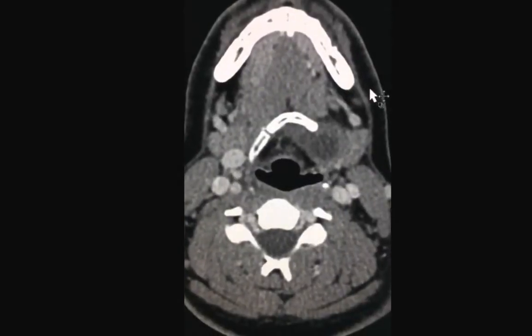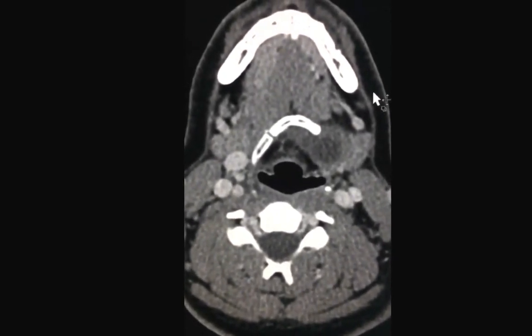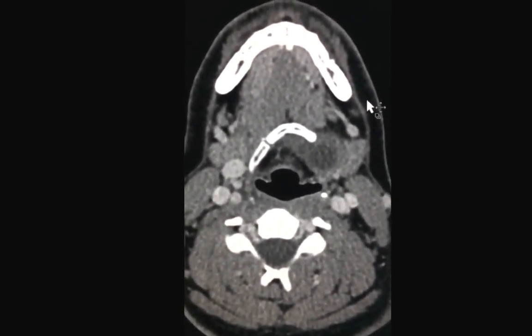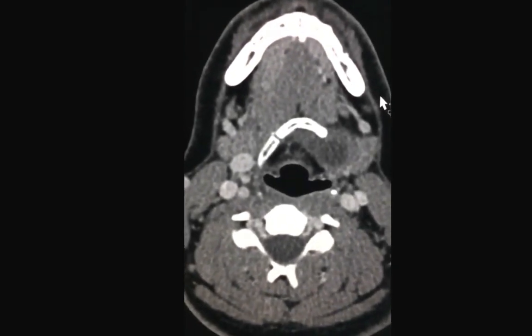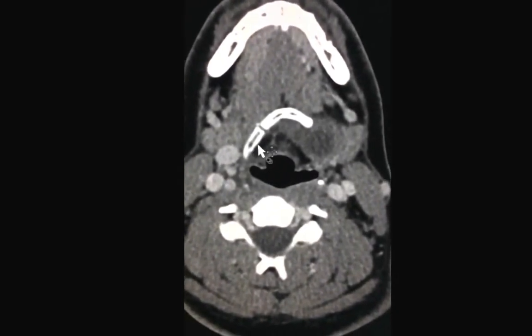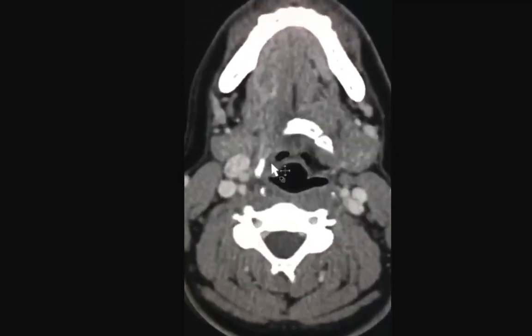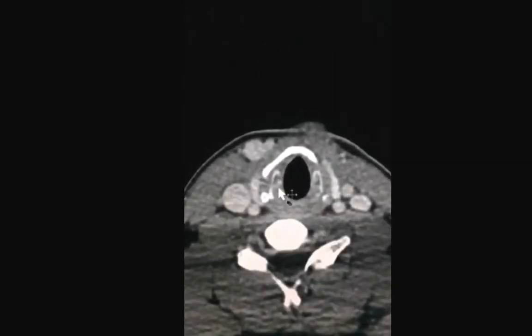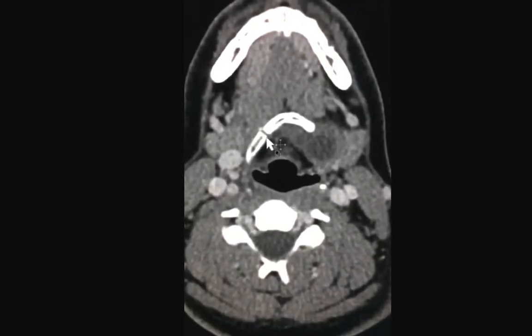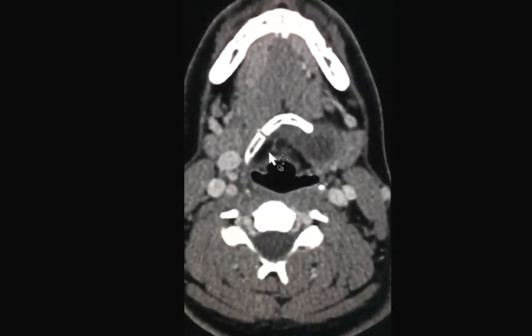This was a good case with a bit of information for both the seniors and juniors. First, we recognize that the neck anatomy is a bit complex, but to simplify it, start by knowing the important cartilage. Above below you have HTC, which is hyoid, thyroid, cricoid. The hyoid bone that has these articulations is an important landmark to divide the neck into supra versus infrahyoid spaces.